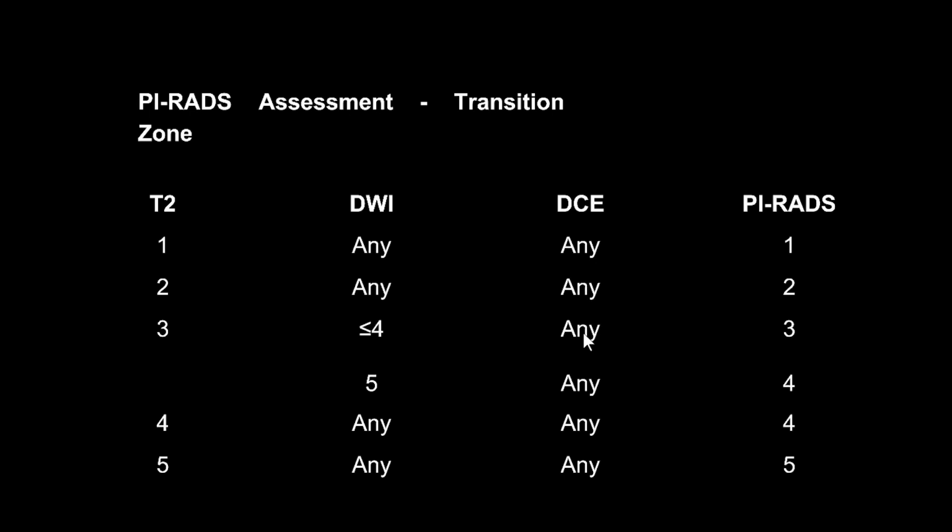So that leads us to the toughie, the PIRADS 3. Now, in a PIRADS 3, the T2 criteria is heterogeneous signal intensity, ill-defined margins, doesn't cross boundaries like the surgical or anatomic capsule, and it basically doesn't fit into a 2, a 1, a 4, or a 5. So if you have this scenario, now the diffusion-weighted criteria kick in.